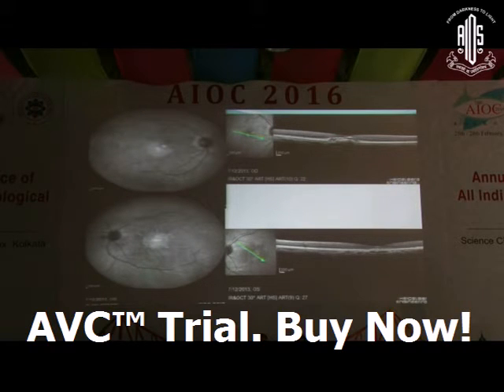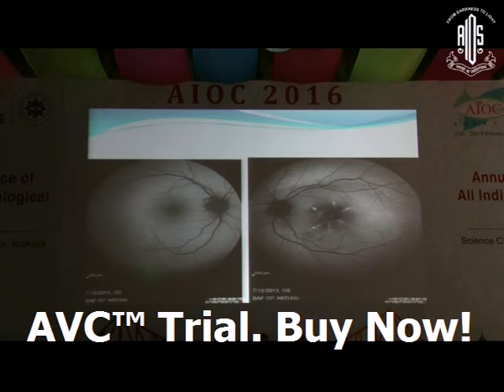We gave intravitreal Avastin in this patient. Patient didn't respond. We gave a second intravitreal Avastin in this patient. Patient didn't respond. Then we said, why is the patient not responding, we should revisit our diagnosis. We did an autofluorescence in this patient, and you can see this autofluorescent area telling us what we were treating was an adult onset vitelliform dystrophy.